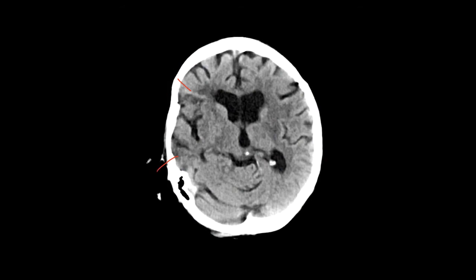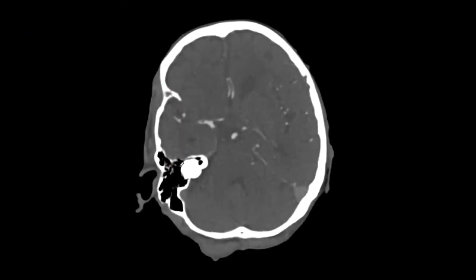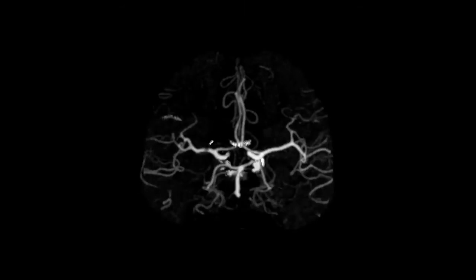Sometimes I can have some volume averaging of CSF, but a lot of times when I start seeing loss of gray-white junction, then I'm wary. And in this person, I am worried about the right MCA, but I'm looking at the entire, this is a CT angiogram, right? Because I can see enhancing vessels. I do see that abnormality. See that focal filling defect within the right M1 segment. It's not totally occluding the vessel, but it is present. You can see the same thing in the reconstruction.